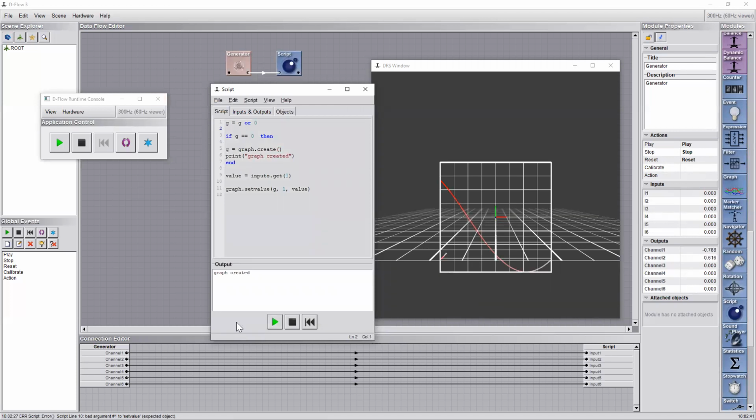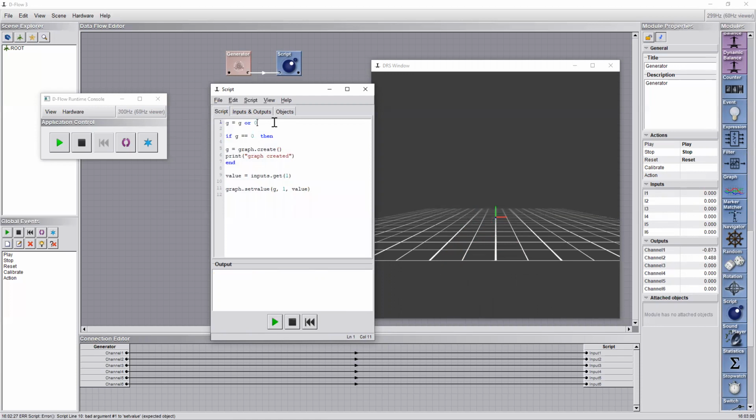You see what's happening. The cool thing is, with G, if G is 0, which is the very first time the graph is created, you can see here, and then the rest is being evaluated, and you can see here nicely that the plot is going on, right? Isn't it cool? So basically, this part is your initialization. Correct. Initialize it, and then you create values here. You create a graph just once, right?